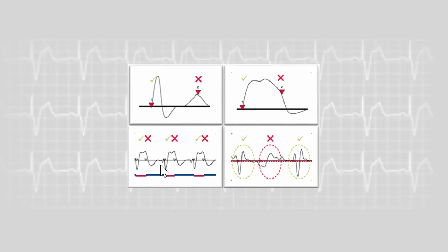The device will also search for repetitive sequences between 2 intervals. You can see here repetitive sequences between 1 short interval in red and 1 long in blue. Short, long, and this is also in favor of an oversensing. This algorithm evaluates 3 successive detections, and it discards the middle detection when the first and third complexes are morphologically similar, whereas the middle complex has a different morphology.